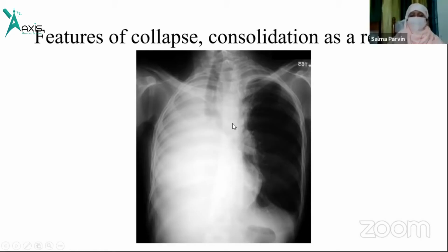This is one of the important presentation patterns of the mitotic lesion involving the hilum. And we know most of the bronchogenic carcinomas are central or paracentral. So they are producing this sort of presentation, that there is a total pulmonary collapse and mediastinal shifting. Also, there is collapse consolidation together and effusion. So this is another presentation pattern of the pulmonary mass. The hilar mass bronchogenic carcinoma.